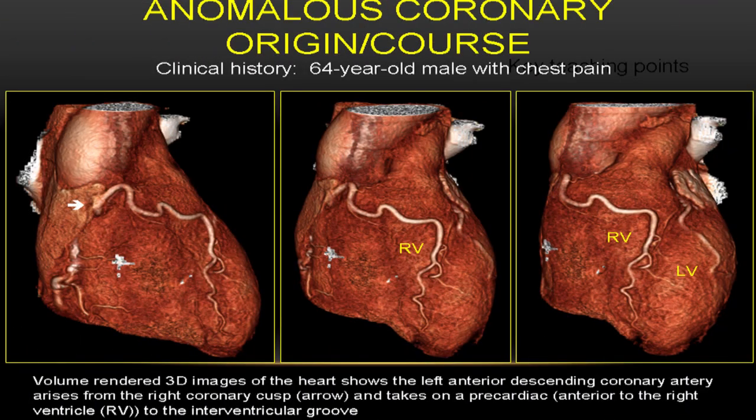And I'm not going to talk about ischemic coronary disease where you're picking out lipid-rich plaque versus calcified plaque in small vessels, but all of that is very doable now on multiple platforms. But really where in the congenital heart world, people have seen this come into standard practice, I believe, is in anomalous coronary arteries. Here you can see a LAD coming off a right coronary cusp.